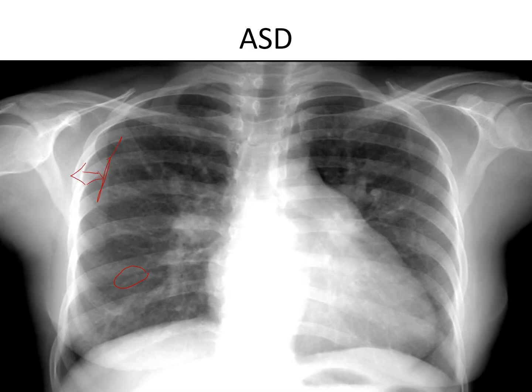This is the region where normally pulmonary vessels are not visualized, but in plethora pulmonary vessels can be seen in the lateral one third, and there is associated cardiomegaly, and this is due to the right atrial and right ventricular dilatation. If the patient develops pulmonary hypertension, then the central vessels or pulmonary arteries enlarge in size, and the peripheral arteries show pruning or narrowing of the caliber.